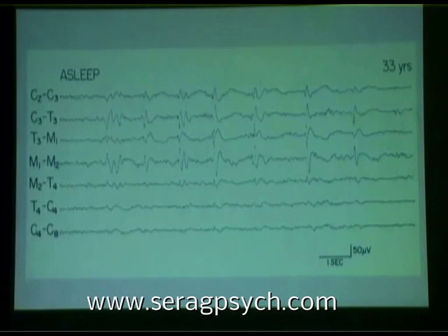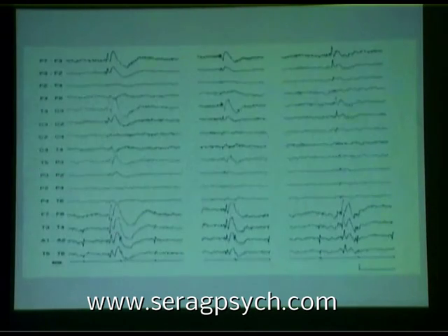We've seen that. And then, again, further emphasizing sleep recordings, notice how you get, again, this cancellation between the left mid-temporal and M1. Eh? In other words, here. So, next, please.